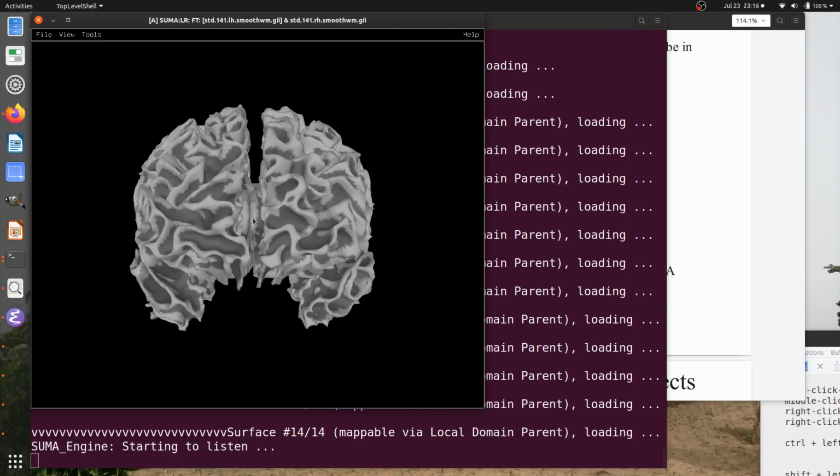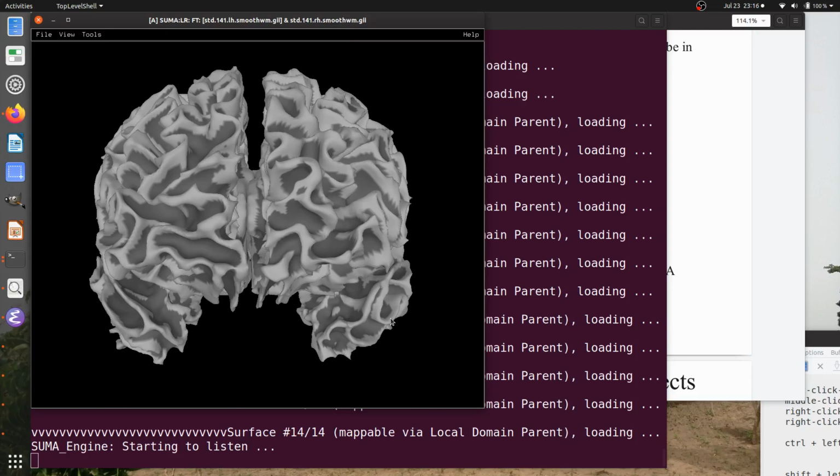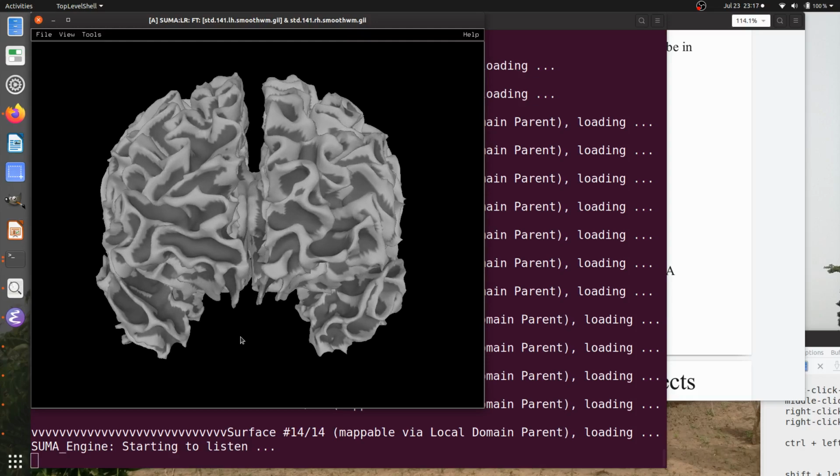Okay, so that's translation. And if I want to zoom in and out, so translate kind of closer and further away from the view, I can use my middle scroll wheel, and while my mouse is over the window here, if I scroll forward, it'll zoom out, and if I scroll backward, it will zoom in. Similarly, with a key press, I can use just the Z key by itself, so little z will zoom out, and big Z will zoom in. So, Shift Z will zoom in. Okay, so translate, rotate, and zoom.